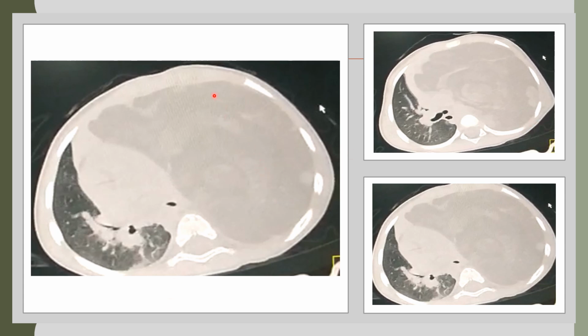What we can see is a very large left lung low attenuation mass, mainly involving the upper lobe and extending into the upper mediastinal fat plane with contralateral tracheal and mediastinal shift. No intrabronchial disease component was detected, although left bronchial branches were grossly compressed and non-traceable. The right lung was mostly clear, apart from mosaic attenuation in the base of the lung due to air trapping.